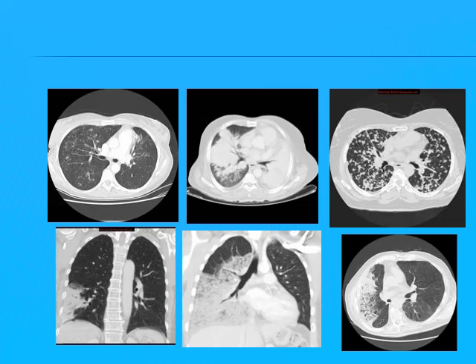So it is a great mimicker that you should keep in mind.